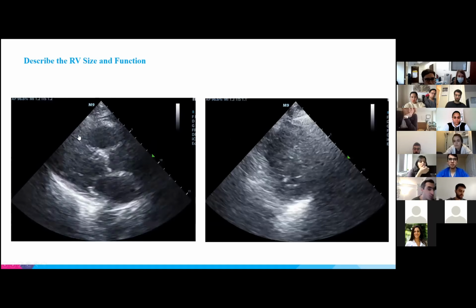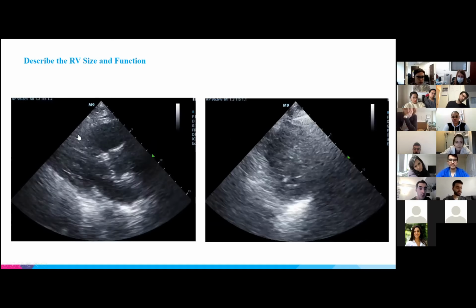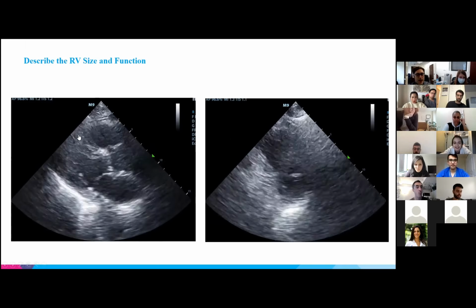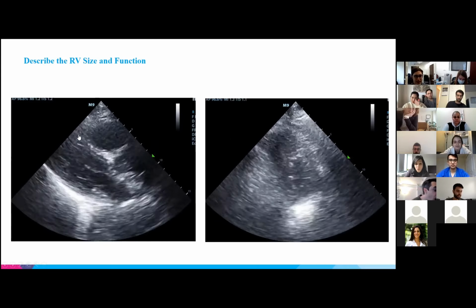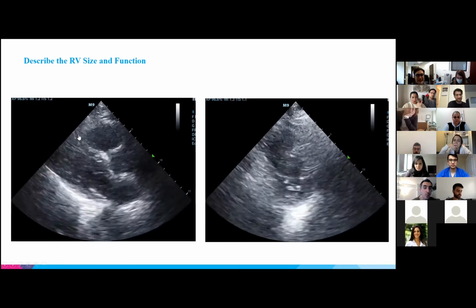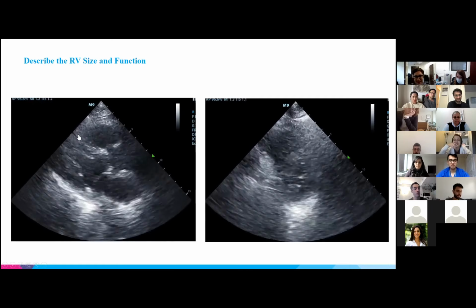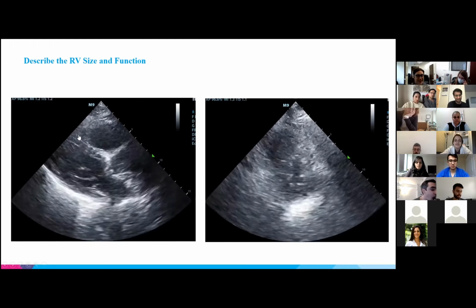All right, so for this example, we have another two clips here, so you can take a look at both clips. These are real patients, real PERT activations. Sometimes the views are not ideal, but it helps us to see practice with these views, and certainly when you get your amazing views when you're practicing, you'll be able to tell right away what's going on.